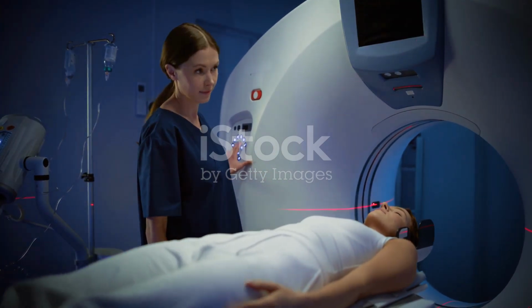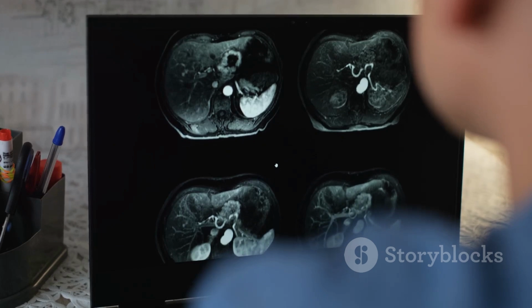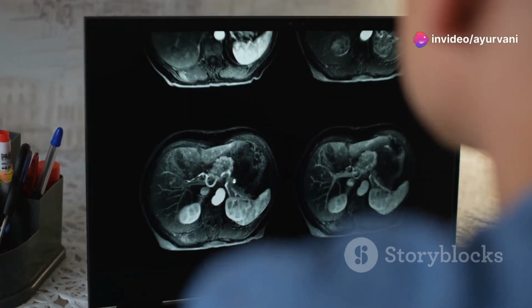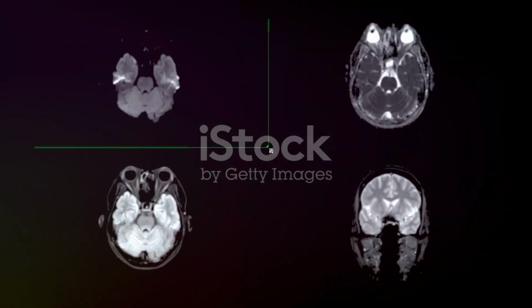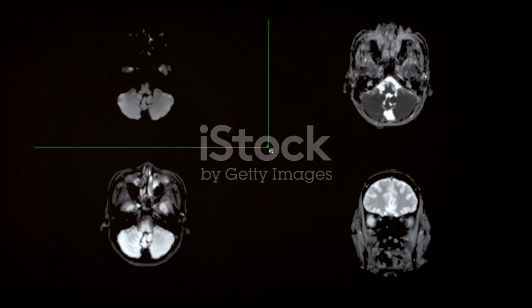Now let's talk about FLAIR sequences. Fluid attenuated inversion recovery helps in identifying subtle subarachnoid hemorrhage by suppressing the cerebrospinal fluid signal, making the blood appear hyperintense. Keep an eye out for these changes, especially in the basal cisterns and cortical sulci.